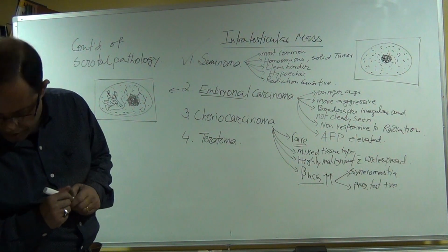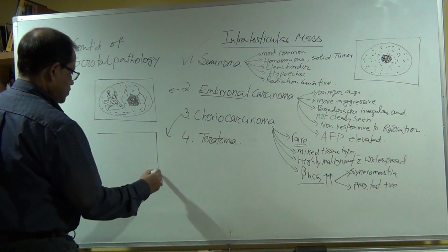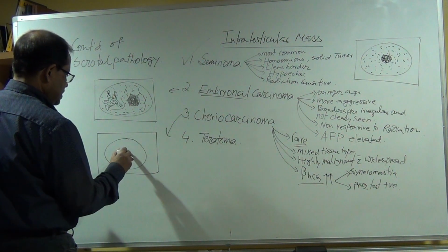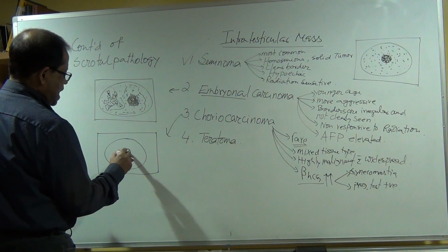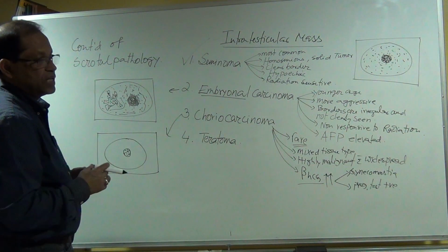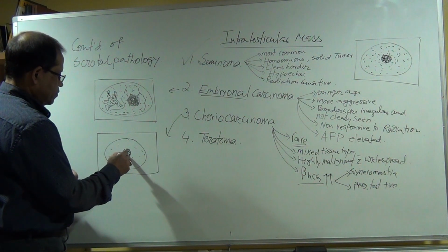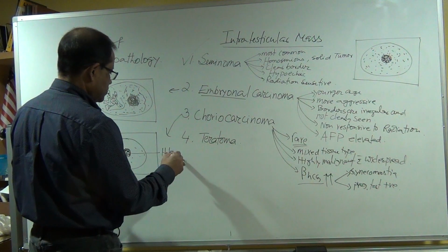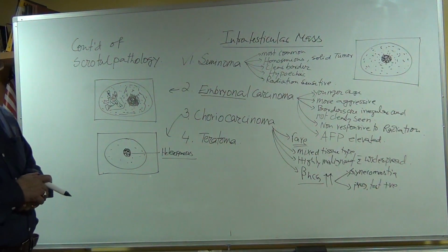Enlargement and is homogeneous, heterogeneous. Okay, so now if this is the testis, usually there is a small mass. When there is a small mass, it does not cause an effect on the testis because the testis is not enlarged. So it would be heterogeneous. Heterogeneous.